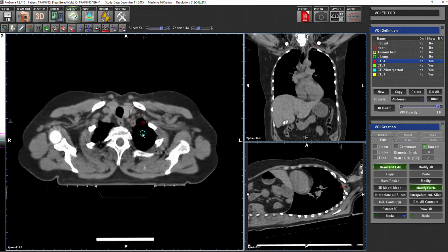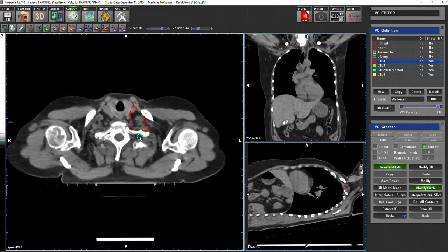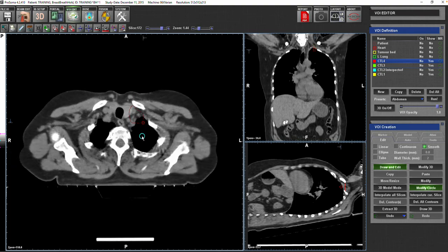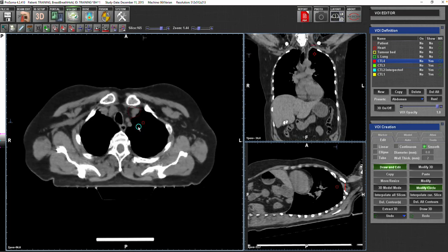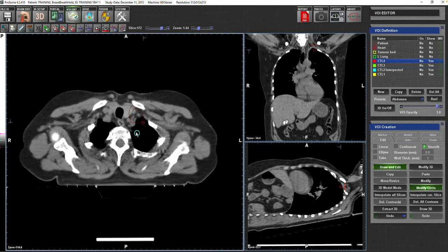You can see that the interpolation is a bit generous because of the difference between the first cut and the middle cut and the lower cut, because the lower cut is very small compared to the upper cut, but the interpolation is not too bad. So I'll choose one slice in the middle, just to make my life much easier, and I will go around the vein again here. You don't have to take the pleura or the vessels clearly. So I will just end at the lateral edge of the scalene muscle, and I will just do another cut like that.